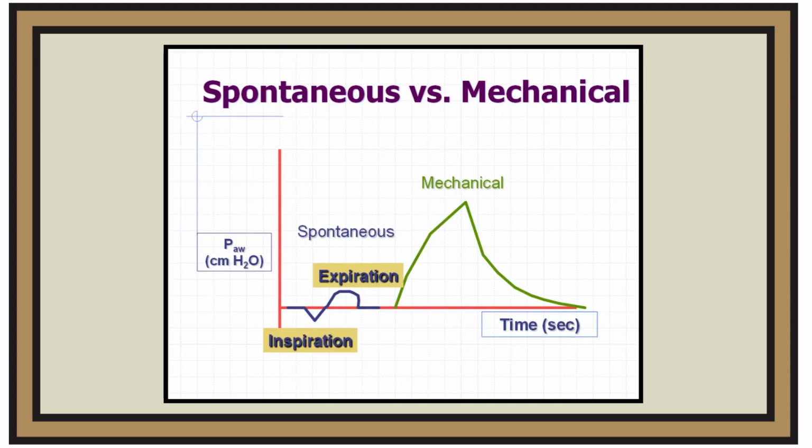The pressure versus time scalar indicates inspiration below the baseline and expiration is traced above the baseline, which is consistent with the normal spontaneous respiratory pattern. Observe that during the inspiratory phase, the pressure curve shows a negative deflection and during exhalation goes above the baseline.